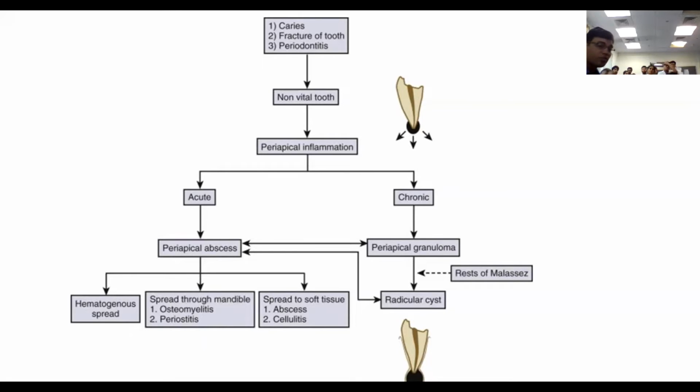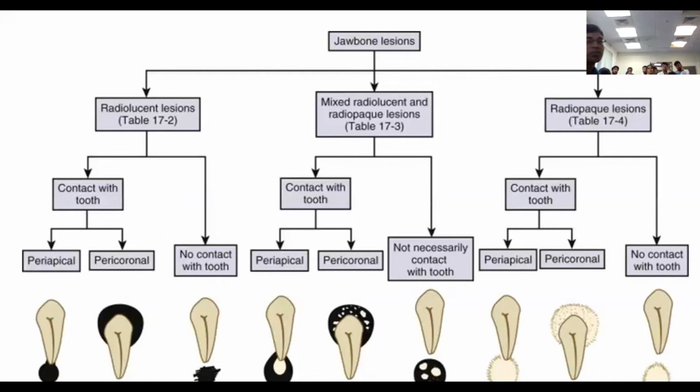And if the tooth is removed, and then you see some cystic areas in the bone, then it is a radicular cyst. So there is caries, somebody has removed the tooth, and subsequently you see there is something lying at that region, that is the radicular cyst.